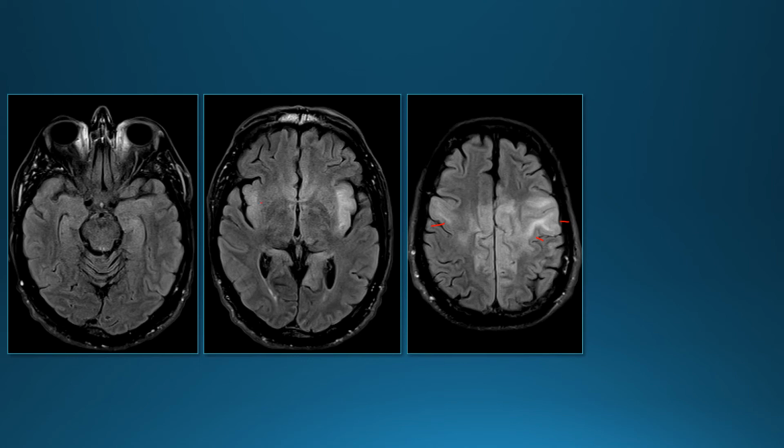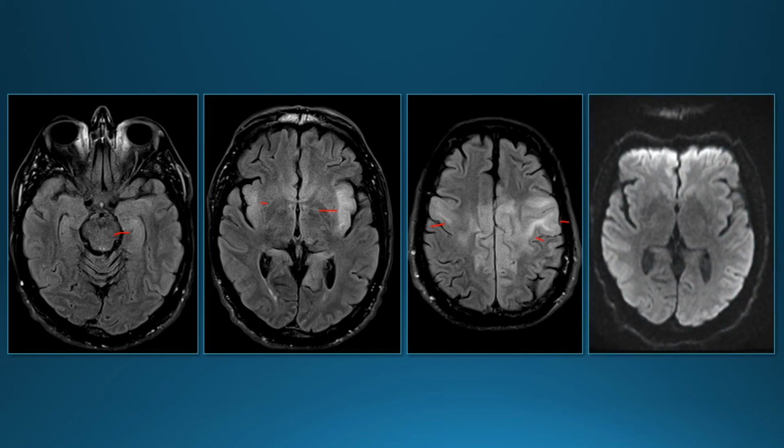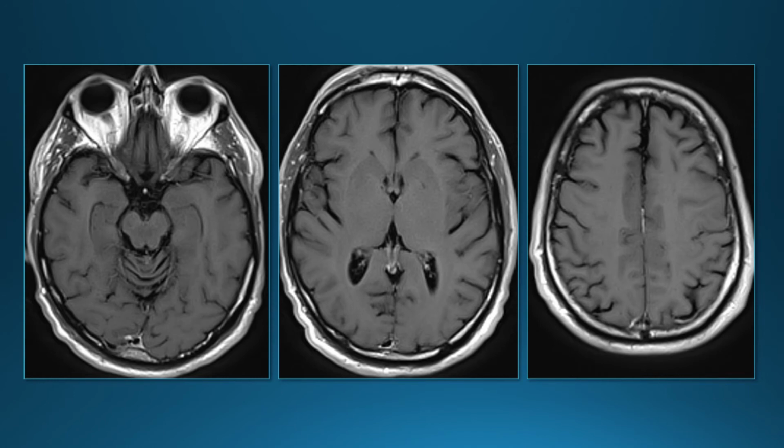It also involves the insular regions here, and maybe a subtle left hippocampus. Diffusion-weighted images don't show any restricted diffusion here. Post-contrast, no enhancement.